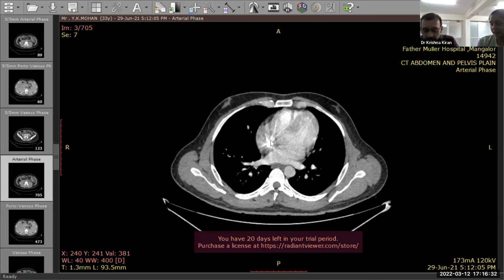In the portal phase, so liver tumors, why do we do this? What is the point in doing these multiple phases? If you do the portal phase, most of the time you will see the tumors, isn't it? Why are you adding these two additional phases? Because the actual blood supply to the liver is such that 80% is supplied by the portal vein and 20% of the liver parenchyma is supplied by the hepatic artery. But for an HCC, all the vascularity is coming from the hepatic artery.